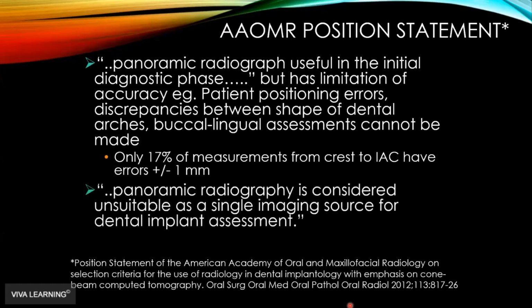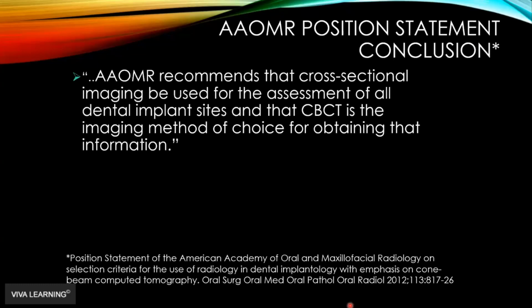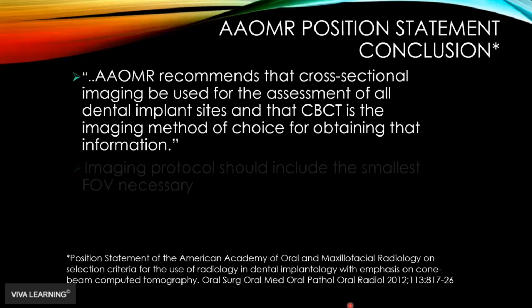So panoramic radiograph might be good to begin with but it's not really a suitable single imaging source for implant assessment. And their conclusion was that they recommend cross-sectional imaging be used for all dental implant sites, and that CBCT is the imaging method of choice. And that's because we'd rather use CBCT than medical imaging.